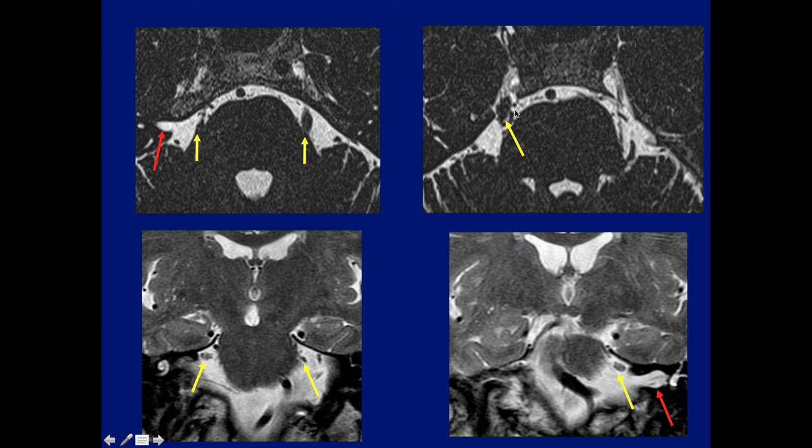Here's another image of the same patient, slightly different level, and we now see the full nerve, but we don't see it on the opposite side. Same problem on the coronal. This looks large, much larger on the right than the left, but on a different slice, we can see that the left is also equal size. And again, notice the IAC here and not on the right side. So just some obliquity will prevent both nerves from showing up at the same time.